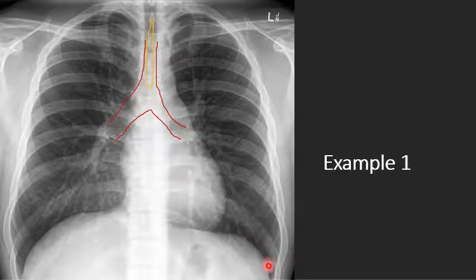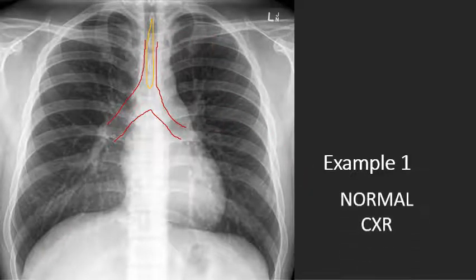And then you look at your diaphragm, looks pretty equal to me. Right is greater than left, that's where the liver is, no air under the diaphragm. And then everything else, I don't see any tubes, drains, lines. And so this is relatively a normal chest x-ray.